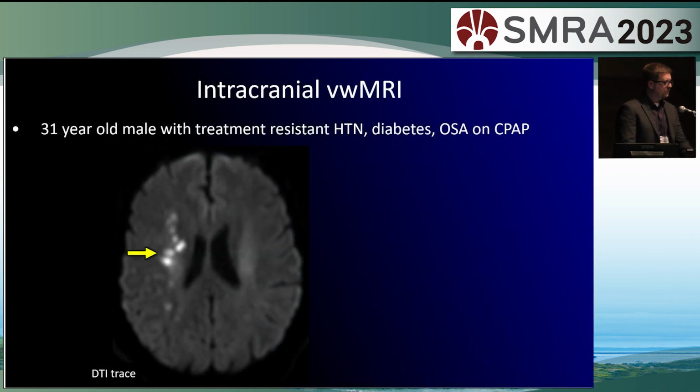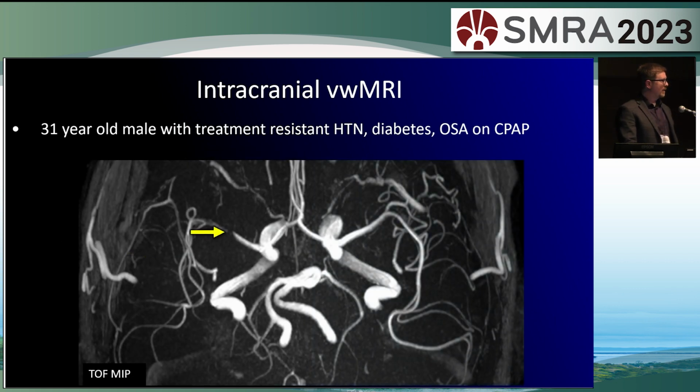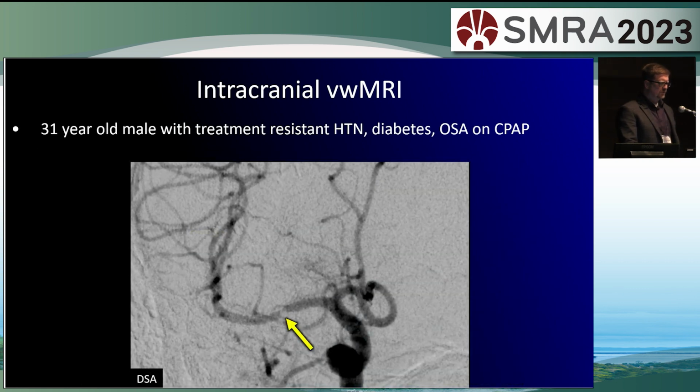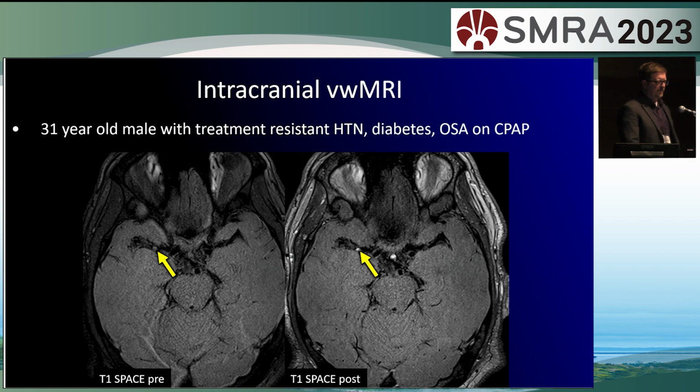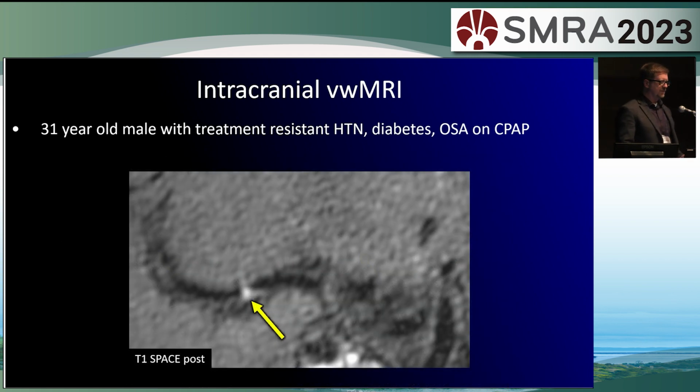This is another case of a young patient, however, who does have atherosclerosis risk factors. He came in with acute right ICA distribution infarcts and a very focal right M1 stenosis. You can see that on angiogram. This appears more shelf-like. On T1 post-contrast imaging, there's a very focal enhancement, and we often have to do reformats to get the best image here. So this is a coronal oblique reformat that shows that this enhancement is eccentric. It's primarily affecting the inferior margin of the M1.